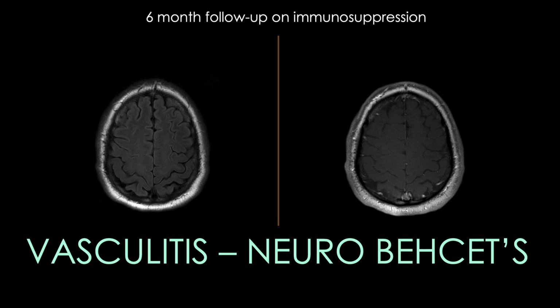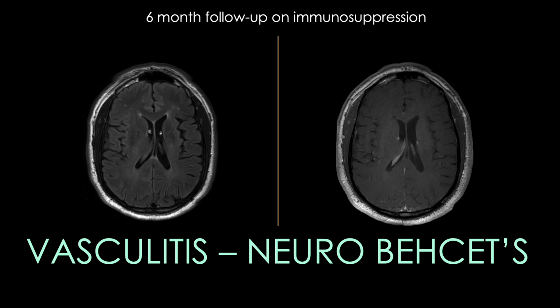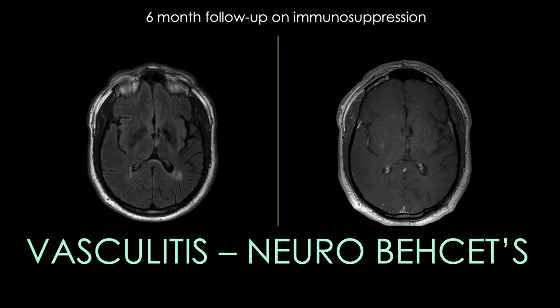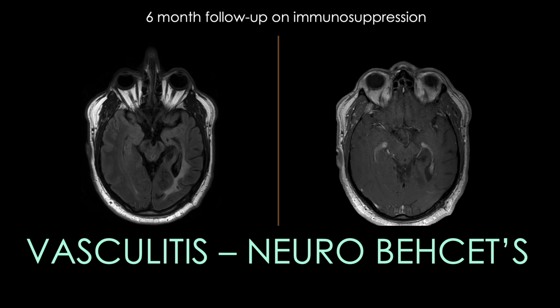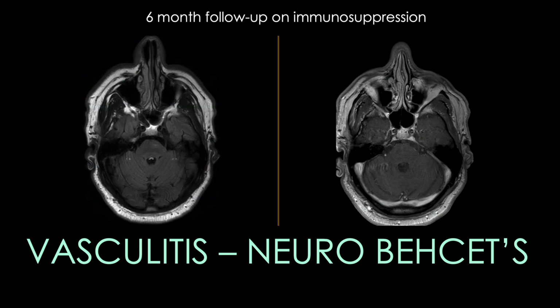This patient was put on immunosuppressive agents, and their follow-up study half a year later showed resolution of the enhancement and edema within the deep brain structures and midbrain as previously seen, with some residual T2 hyperintense signal, most likely representing gliosis as a result of the prior injury.